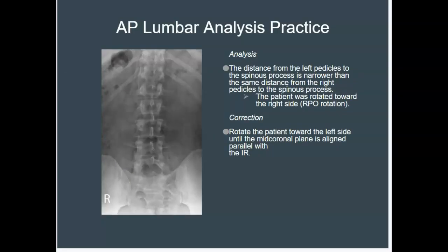Looking at this practice analysis, we can see by utilizing the tools that we just learned that the spinous processes here are somewhat closer to the left side, okay?